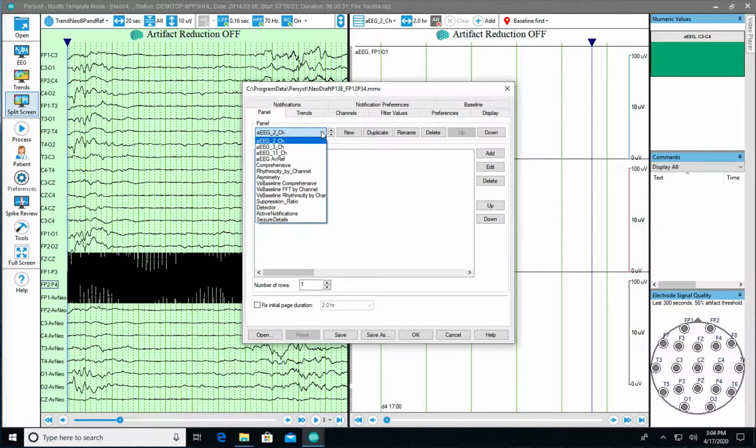So in P13, E2 or later, E1 as well, E1 and A2, you can go ahead and reorder the panels. The earlier versions of P13 and back to the mists of time when the trending first came out back in the late 1990s, early 2000s, you couldn't do it. Now you can do it. So that's a good feature. Anyway, so we put it at the top of our list, and if we save it, that'll be the default panel. So whatever panel is shown when you hit save, it gets done. So I'm going to hit save.